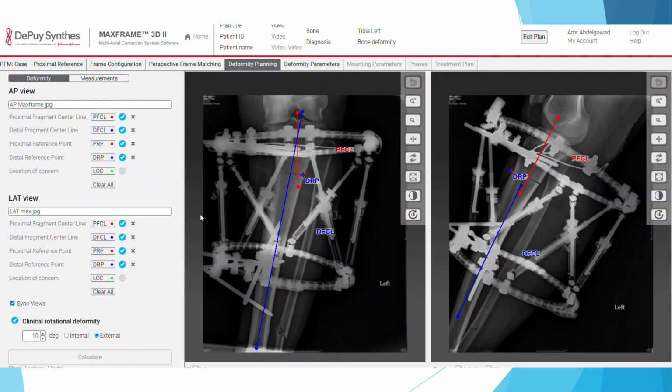So here it tells you that this will basically result in telling the computer that you want the distal and the proximal. What is the distal and the proximal? The software is trying to bring the distal point to the proximal point. So if I say that the distal point is here, for example, that tells the computer that I want to bring this dot to this dot.